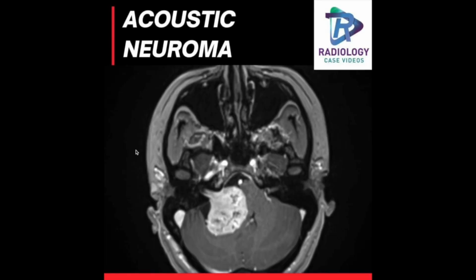This is the next flashcard, acoustic neuroma or vestibular schwannoma. It is one of the most common CP angle tumors that arises from vestibulocochlear nerve. In this image, there is an extraaxial lesion in the right cerebellopontine angle, which is intensely enhancing with few non-enhancing areas, and the tumor has intracanalicular extension, which is suggestive of vestibular schwannoma, and this appearance is called ice cream cone appearance. The cone part being the intracanalicular extension, the ice cream part being the tumor.